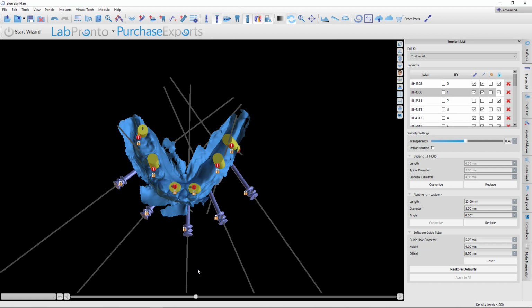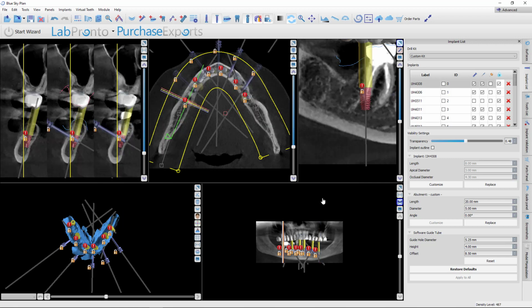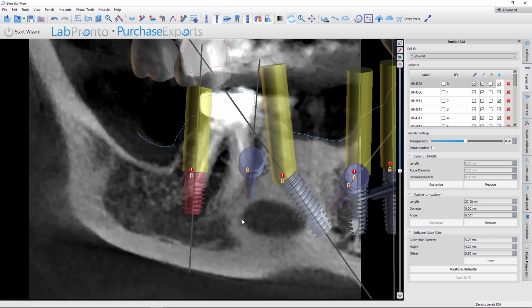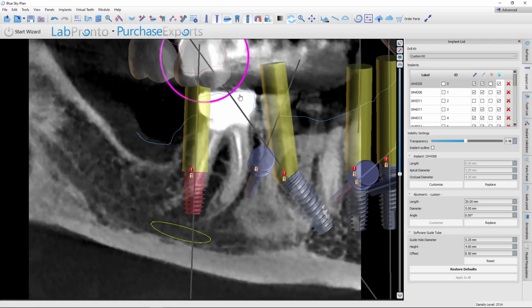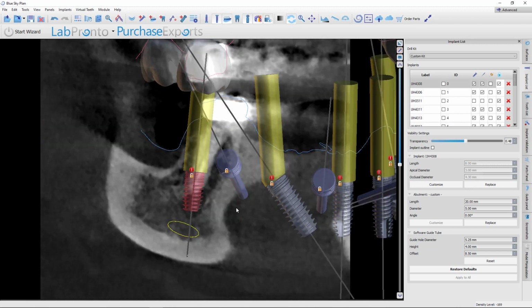Because if you remember back to your picture, she's got some fairly large masseters. She's damaged a lot of teeth. That's obviously an indication there might be some parafunction going on. So let's jump through the lower implants, starting here on the bottom right. You can see that one is going to go in the distal socket here. And I'll turn on the nerves so you can see that. So we're about 2 millimeters from the nerve. Can't really get much closer than that.